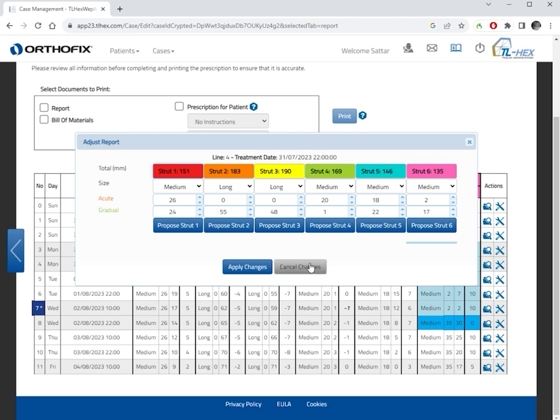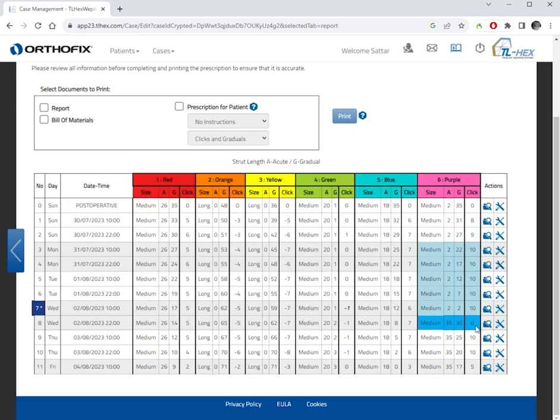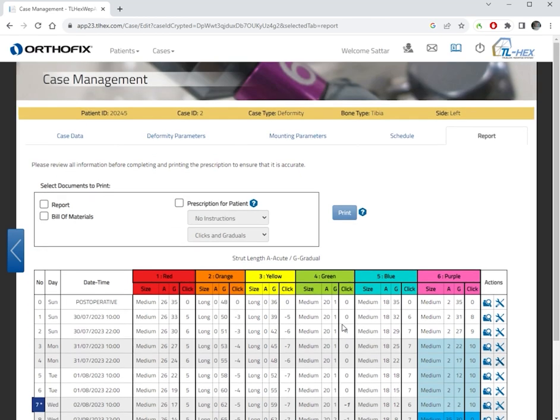These are really very useful. For example, you can change this one. You can change the adjustment here. If you wanted to do the adjustment here, you change them through the adjustment option. Okay, now we understand this table.